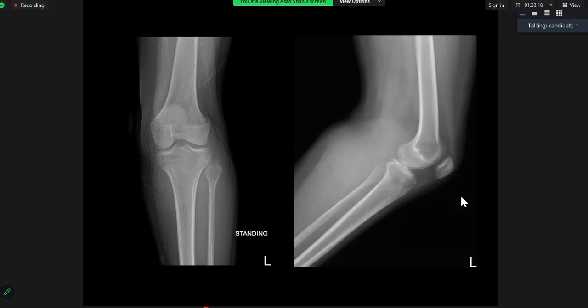Yeah, there is a large soft tissue mass involving the posterior aspect of the left knee. Still, I could not appreciate any definite cortical erosion. I could not appreciate any internal calcifications. I would like to correlate this with MR if available or ultrasound.